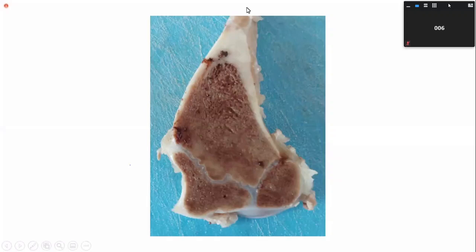Good. So along with the diaphysis, you get the metaphysis, and then you get the growth plate, and within the growth cartilage, you get the epiphysis, the secondary epiphyseal centers, right? So they start growing separately on the growth plate. And then they will grow. Ultimately, they will fuse with the metaphysis, and then the growth plate will disappear. So with that, the bone growth will cease. That's how it happens, right? So then you don't see a gap between the metaphysis and epiphysis. That's how the final bone formation takes place.